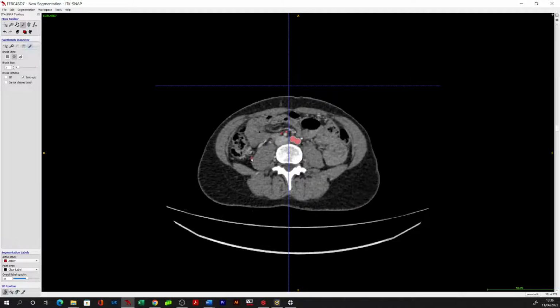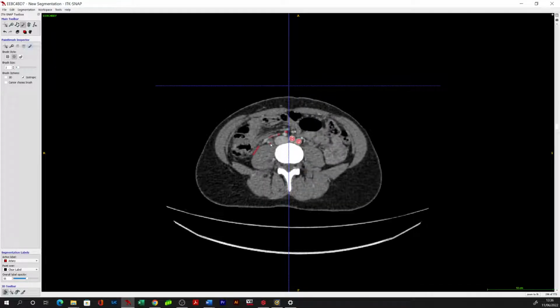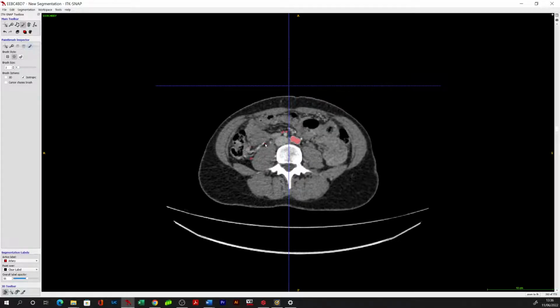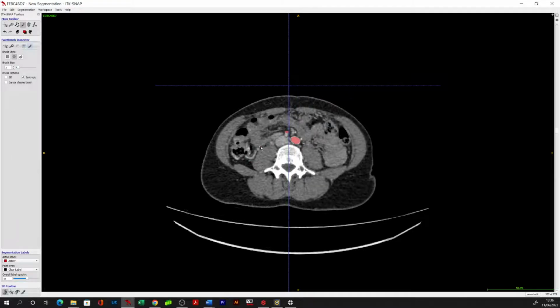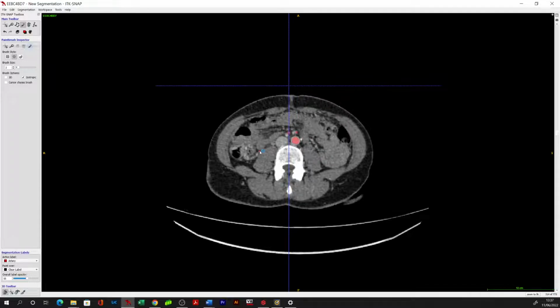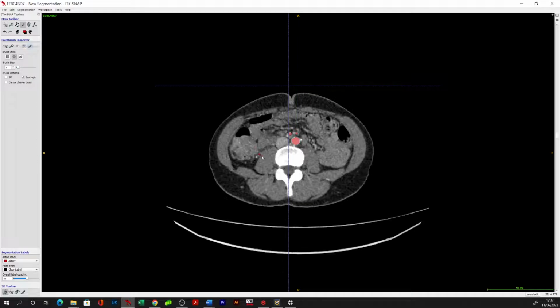Certainly for people who are not familiar with the anatomy, I think some of the more experienced practitioners who are used to seeing this anatomy intraoperatively will get a better sense of what vessels represent what based on where they're inserting into the SMV or Henle. But people who are just starting out in this operation will probably struggle to differentiate, say, a middle colic from an SRCV, etc., if you don't include where the vessels actually terminate.